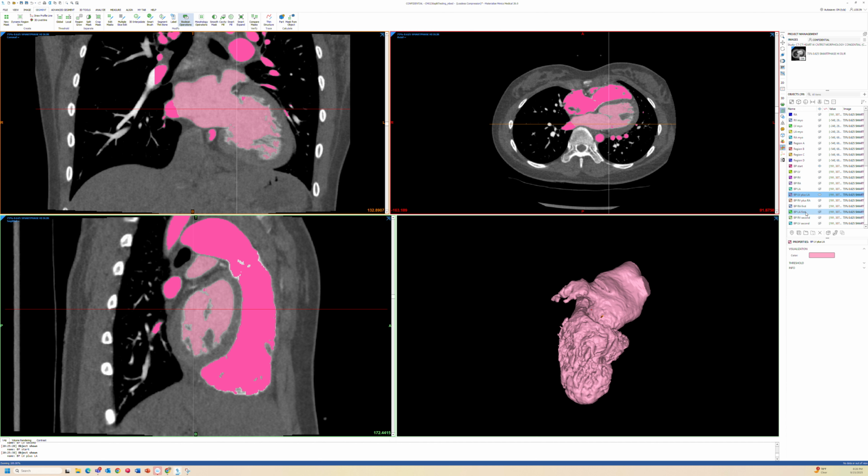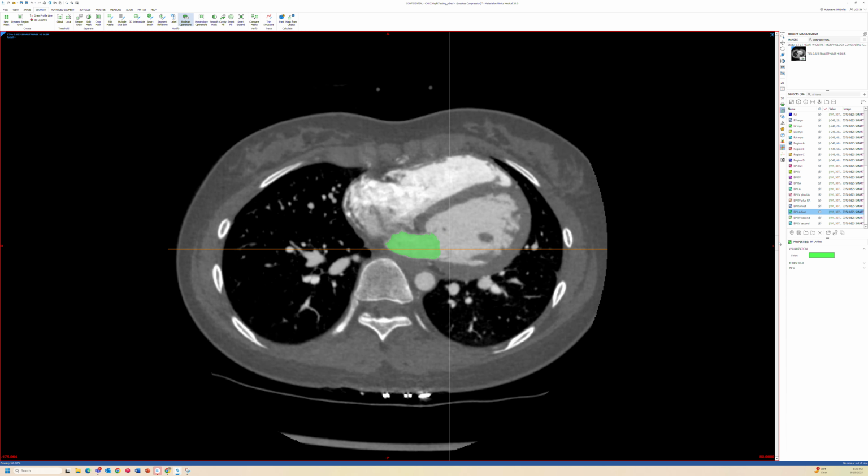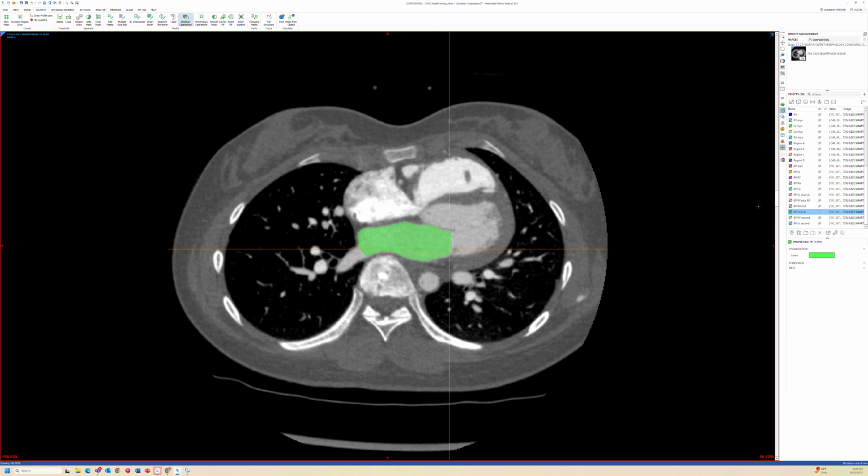And if you look up here, you can see where, what else is on? Here we go. So we can see how we're just letting it come down into here because we want a degree of natural state and consistency.